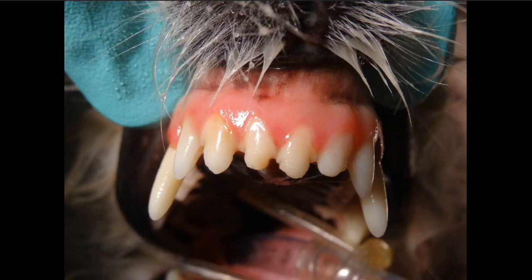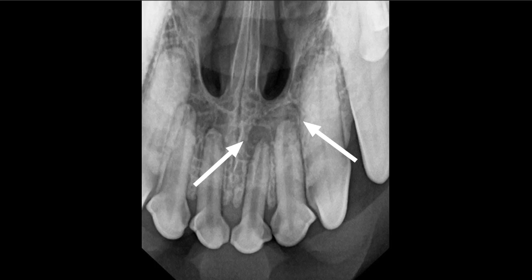And if you look closely there, you're going to see that there's some discoloration. Look at these three teeth versus the color of the other teeth, especially that second left maxillary incisor that's to the right of the arrow there. That one's pretty white. Those are kind of cream colored. So that's a good indication there might be some problems there. And you look at that radiographically, and lo and behold, two of those have a very distinct lucency. All four of those central incisors have an increase in the pulp cavity diameter compared to the pulp cavity diameter in those lateral incisors. So those are all dead.